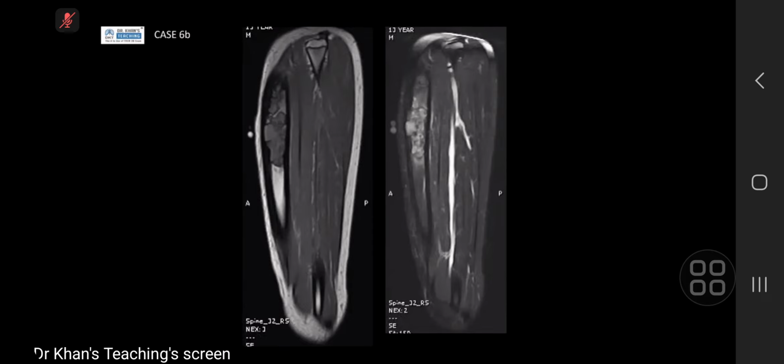With subtle edema on the medial side, but I can see the lateral cortex to the fibula. I can see it well defined, but the medial cortex is encroached and destroyed. And so actually, do you mind if I stop you? Is that okay? Actually, the cortex is thickened. Yeah, on T1 I can see the cortex well defined. It is basically growing into the cortex.